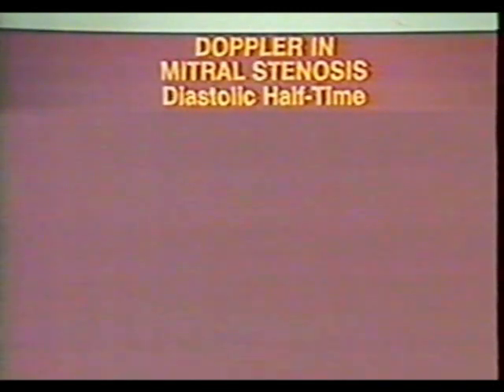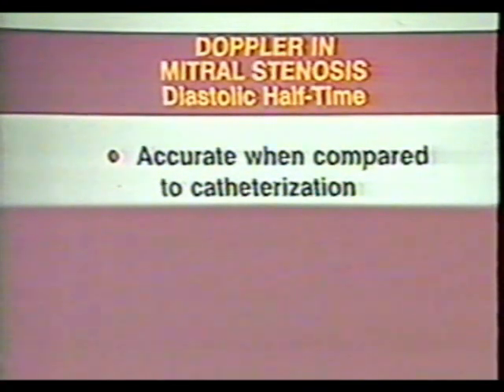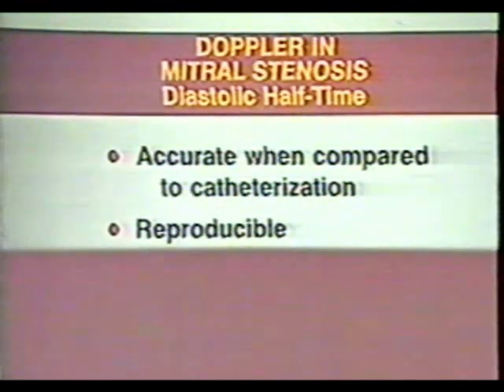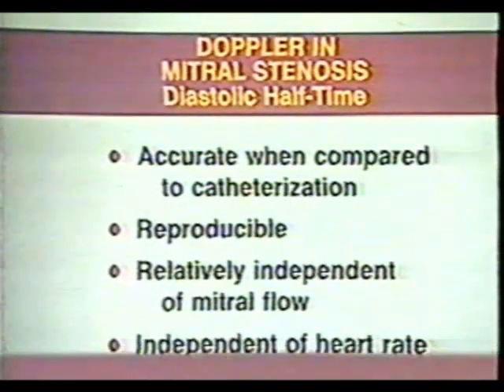The diastolic pressure half-time determined by Doppler has been shown to be accurate when compared to the pressure half-time determined at catheterization. The half-time is reproducible, relatively independent of mitral flow, and independent of heart rate.